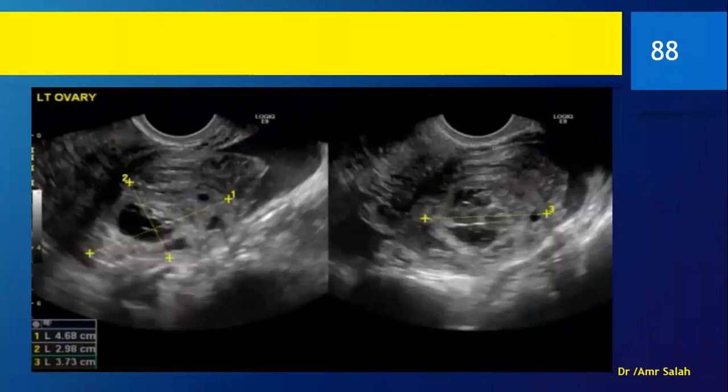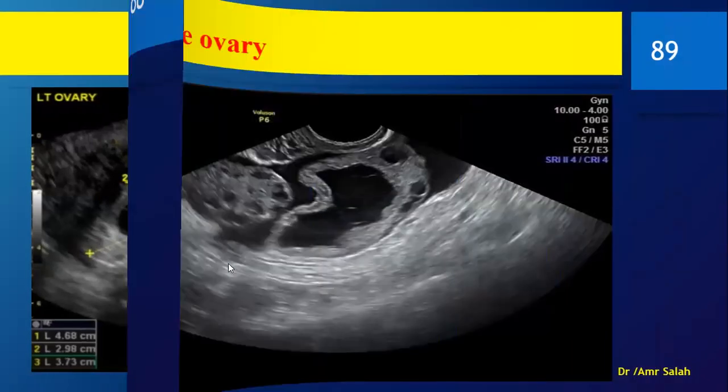So basically, she would have an ovarian lesion. This is the ovary. We see it by the follicles, and we have this irregular cystic space because it ruptured, and we have the free fluid in the pelvis. So this is ovarian apoplexy, that's to say, ruptured ovarian cyst.